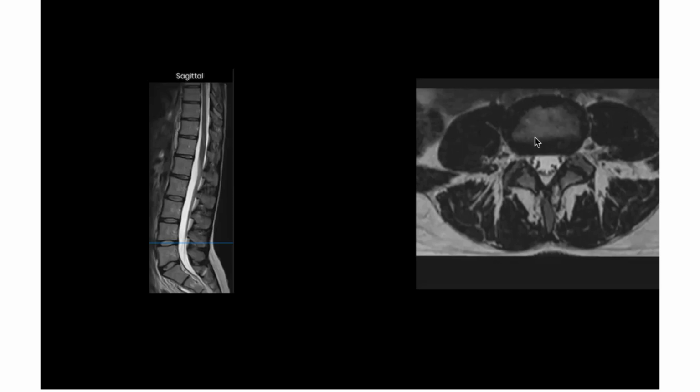All right. And where is the exiting root now? The exiting root is already out of the foramen now. Right? And look at this traversing root. Earlier, everything was here. Now the traversing root is going towards the periphery. It's not ready to go out of the thecal sac. At the disc level, it is still within the thecal sac, the traversing root. Exiting root is out. Okay.